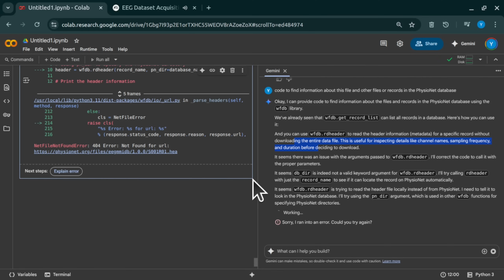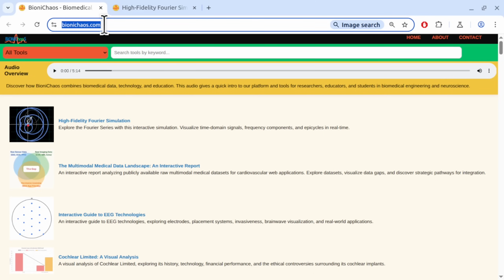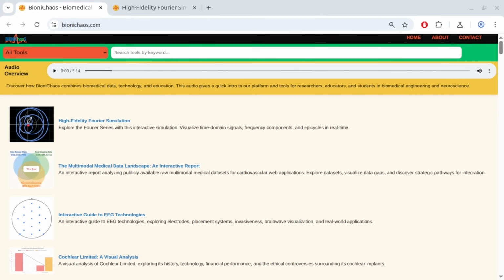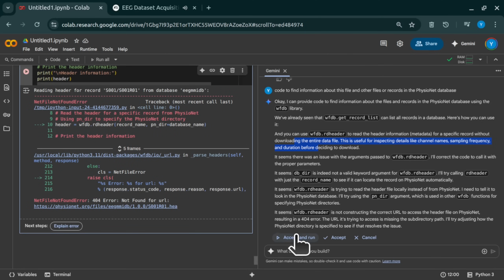Okay, about a minute. And we saw channel names too, right? Things like FC5, C3, CZ, O1, Oz, O2. They looked kind of technical. They are, but they're standardized. Those names tell you exactly where the electrode was placed on the head according to the International 10-20 system or variations of it. Okay. So F for frontal, C for central, O for occipital, back of the head. Exactly. Cz is right in the center top. O1 and O2 are over the visual cortex area. So the names directly link the data channel to a physical brain region, which is obviously super important.